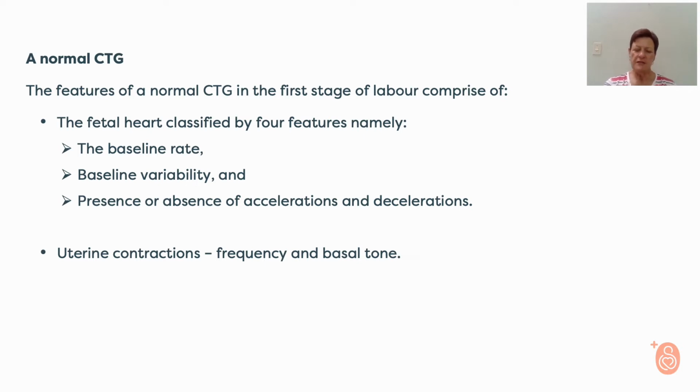And as I've said in one of the previous lessons, it is so important that you always try your very best to get a good recording of the uterine contractions as well, because it's almost impossible to correctly interpret the fetal heart without a good tracing of the uterine contractions as well.